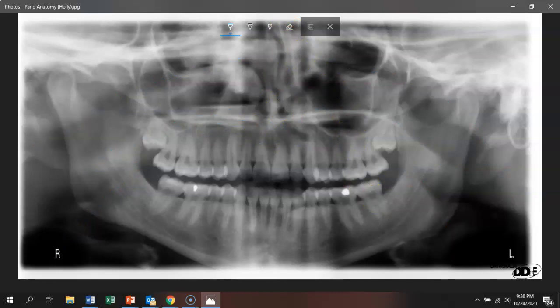Then let's see, what else can we find here? You can see the hyoid bone down in here. Oh, I keep wanting to ask you before I point it out. Hyoid bone down in here. And then where would the soft tissue of the ear be? Can you outline it with your finger on the left side? It's right here, the soft tissue of the ear. And the external auditory meatus is a little bit hard to see, but I would call it right about there.